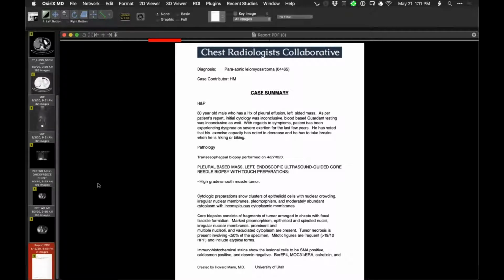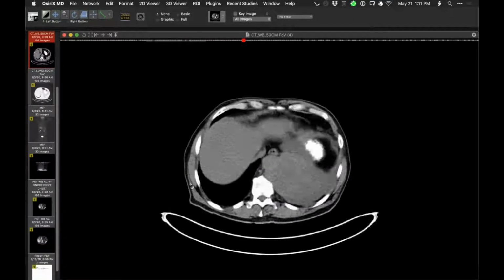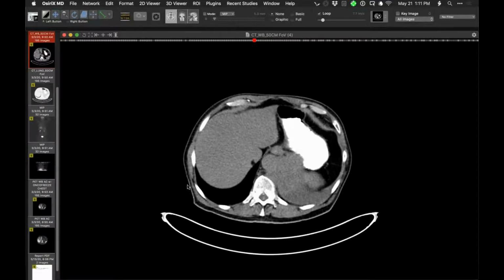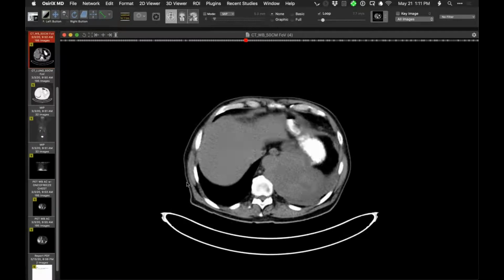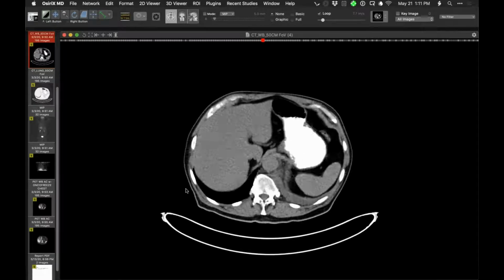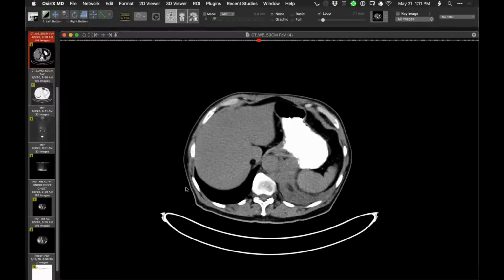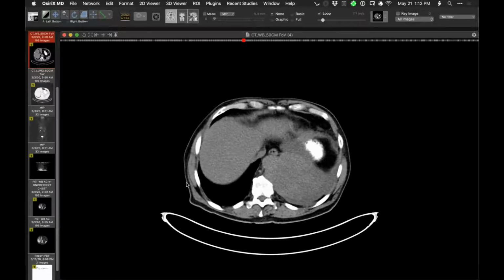Perhaps arising from the crus, or who knows where it's arising from precisely. But does everyone agree that it seems to be growing primarily maybe para-aortic, not that it matters that much, maybe retrocrural space, and just being very large? Yeah, that's a tough one. The center of it seems to be maybe pleural, but it does seem to be biggest here.